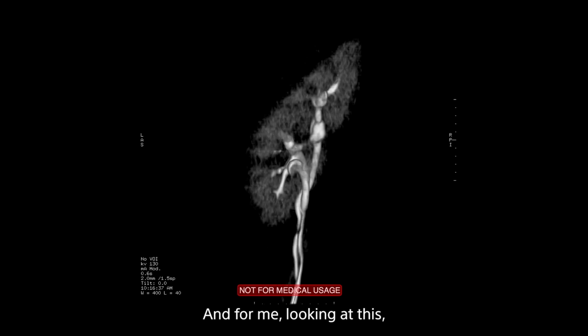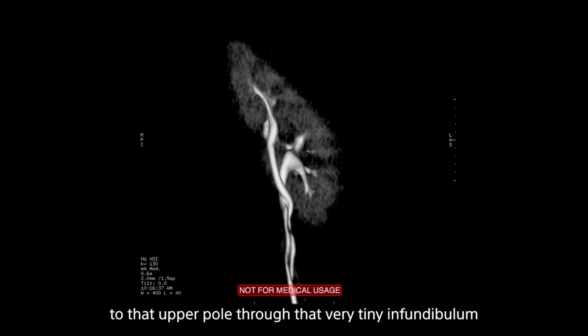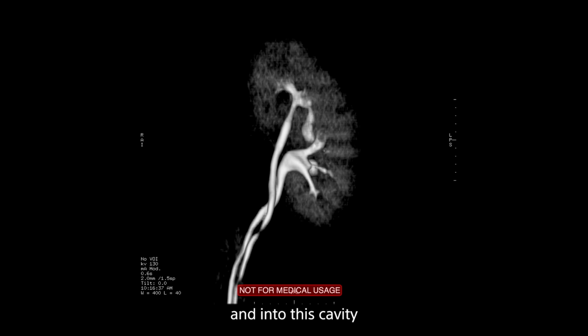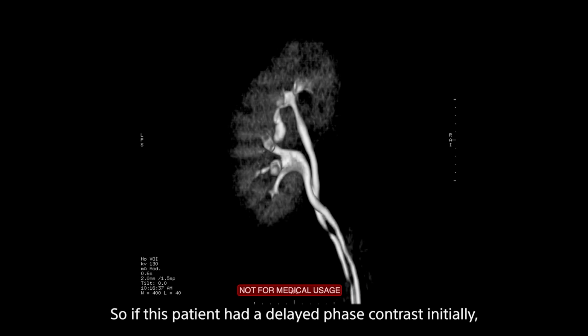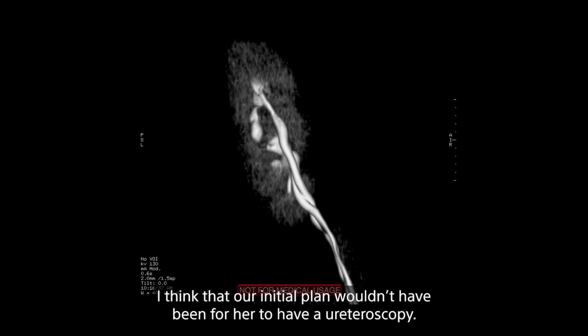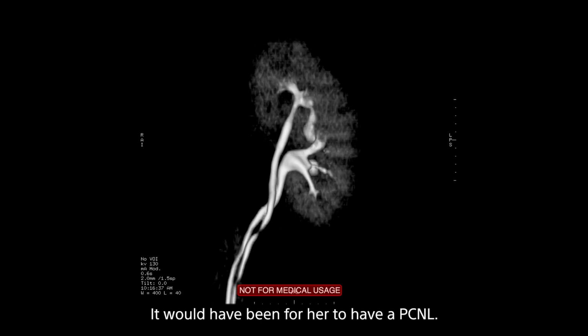And for me, looking at this, I would challenge anybody to think that they're going to get up to that upper pole through that very tight infundibulum and into this cavity to manage those ureteroscopically. So if this patient had a delayed phase contrast initially, I think that our initial plan wouldn't have been for her to have a ureteroscopy, it would have been for her to have a PCNL.